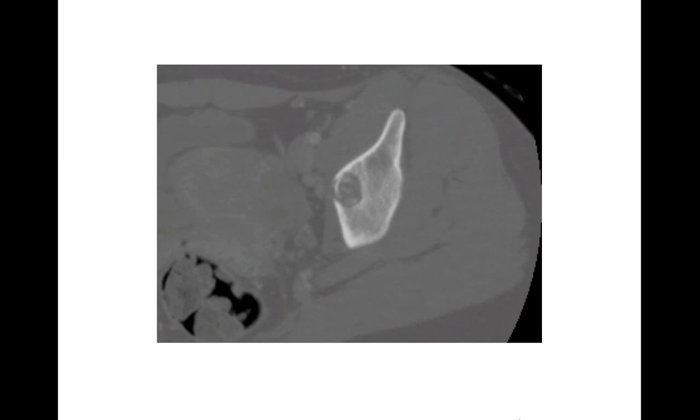So we're going to think of more benign conditions. This one turned out to be Langerhans cell histiocytosis, which is certainly not one of the more common things you're going to think of, just to show you that it can look like a benign lesion. Certainly, again, in an older adult, I would absolutely consider metastasis still in this case as well. And this was a Langerhans cell histiocytosis.